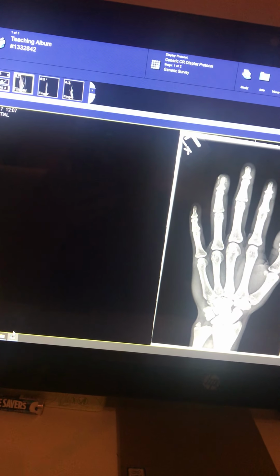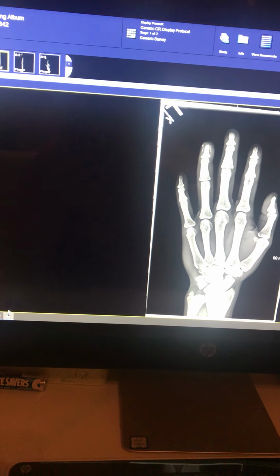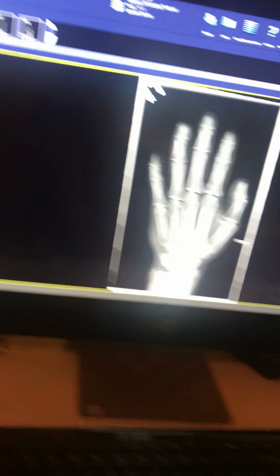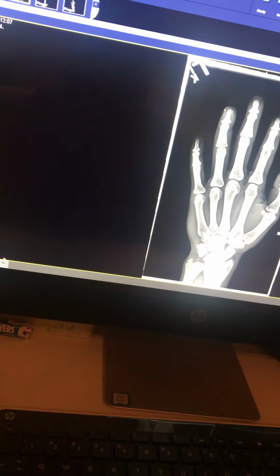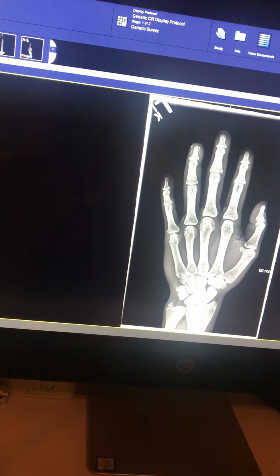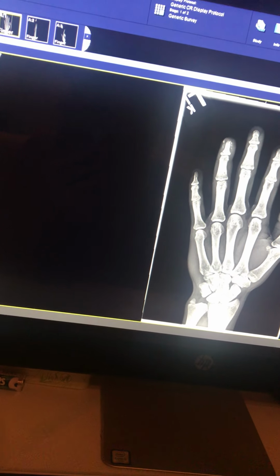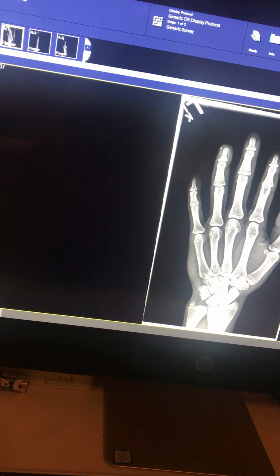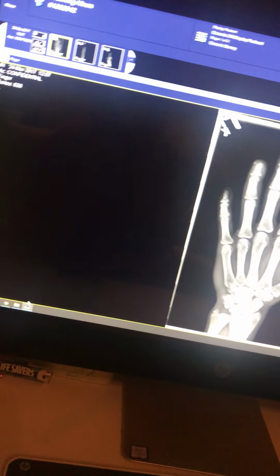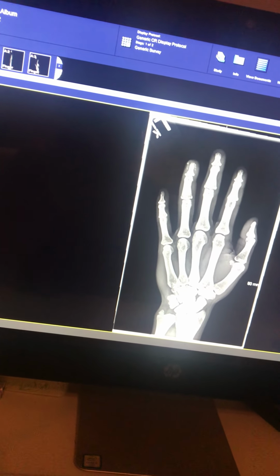The image receptor used was a digital image receptor, 16x16, no grid, AEC used. Technique was 62 kV at 1.2 mAs, 40-inch SID. The views have adequate brightness to show detail and soft tissue margins. No motion is shown, with sharp trabecular details on the compact and spongy bone to reveal that. All 3 exposures are of diagnostic quality.